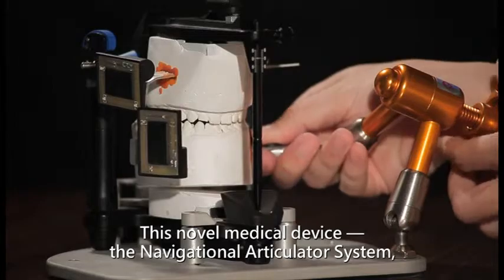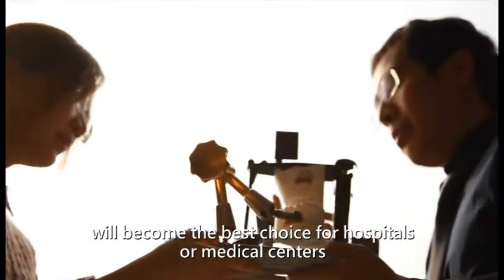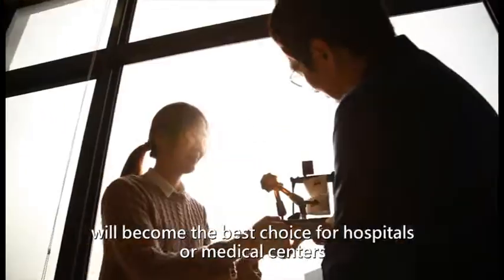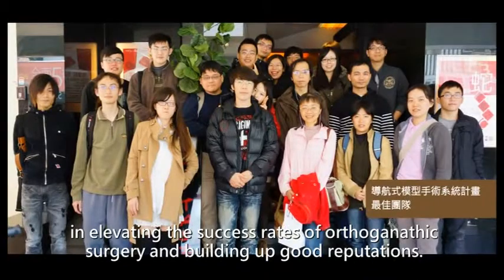This novel medical device, the Navigational Articulator System, will become the best choice for hospitals or medical centers in elevating the success rates of orthognathic surgery and building up good reputations.